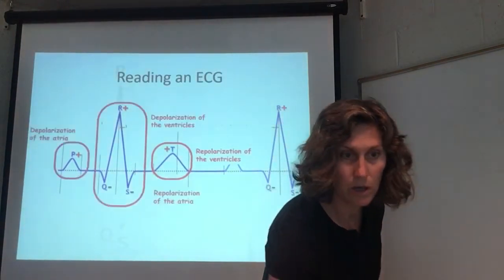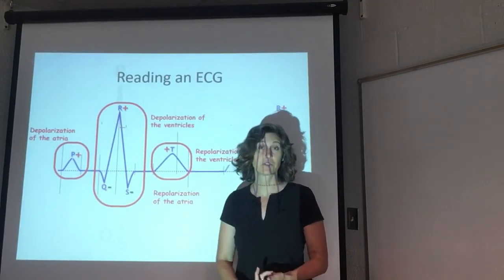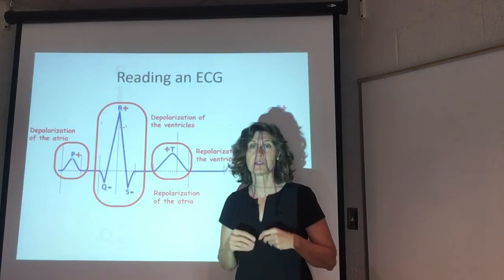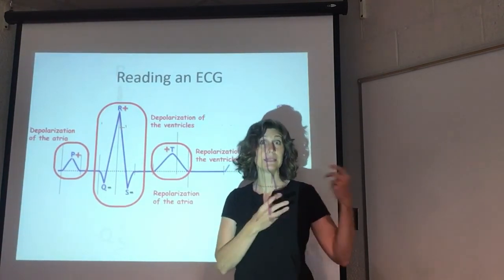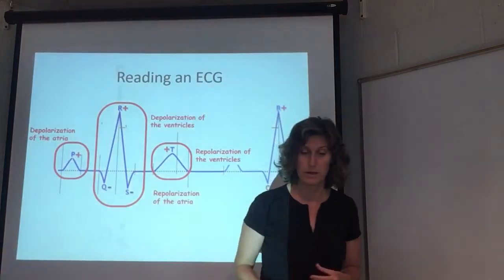So to put it all in chronological order, this is laying it out. Remember, the blood reaches the atria first, then the ventricles, and everything depolarizes before it repolarizes. This should help you remember the order that everything happens in.